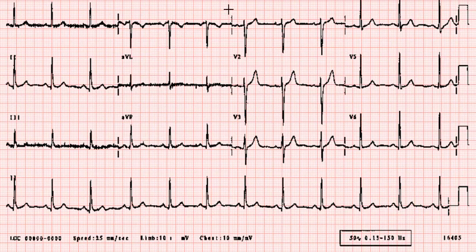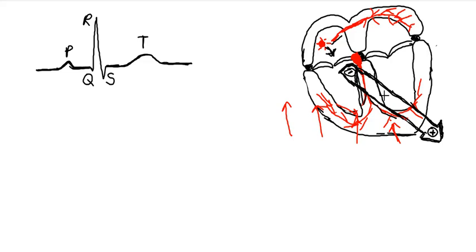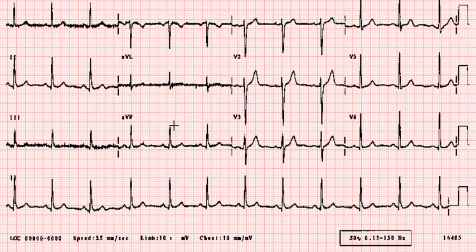Because they are moving in a direction negative to the cardiac vector. That's how different leads have different directions of the QRS complexes and P wave. Mostly it's just aVR that has all negative waves, but sometimes it can also be negative in V1, and the concept is the same that I have already discussed here.